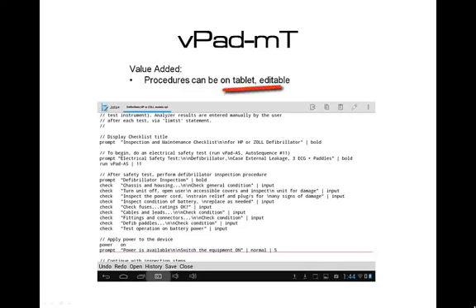These autosequences are text files which reside on the tablet and can be called by a CMMS program simply by using an autosequence call. These autosequences use a simple scripting language called VPL and allow you to expand your check procedures with instructions that were not possible before. Using VPL files allows you to extend the functionality of your automation procedures to include all of vPad's capabilities.